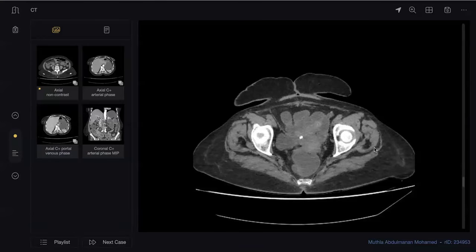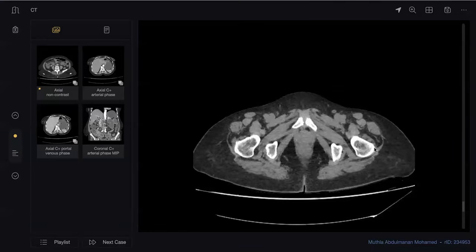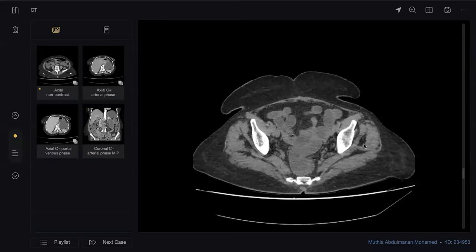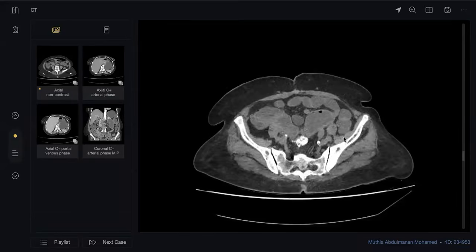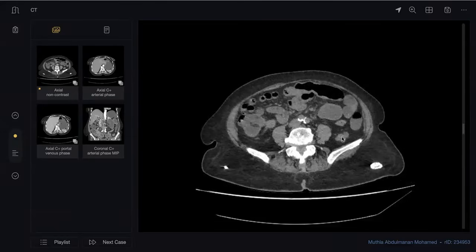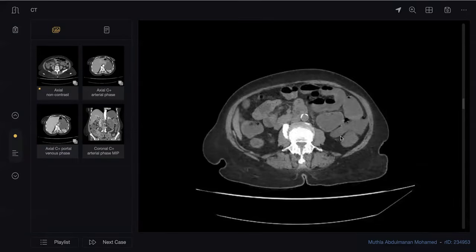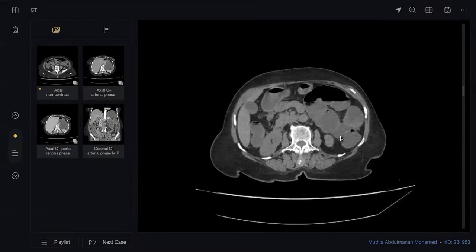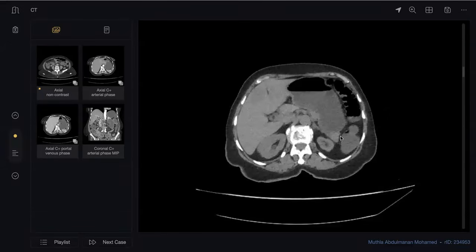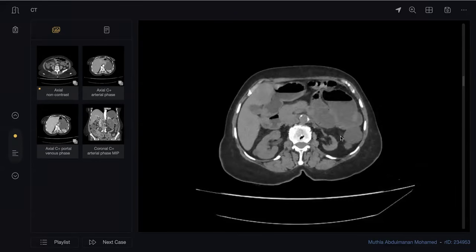This is the uterus. The rectum is also distended. I think there is an ascending colon mass lesion complicated by an intussusception with secondary small bowel obstruction. And there's a hypodense lesion within the liver. I think it's metastatic. I need to confirm it further in the post-contrast study and the coronal, if available.